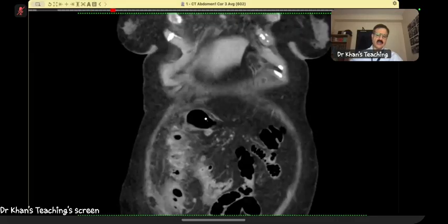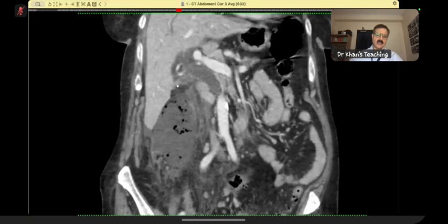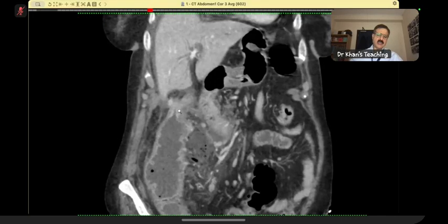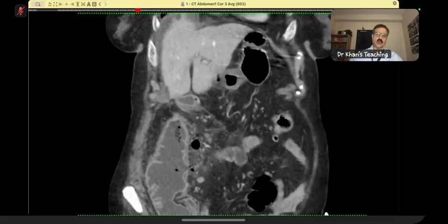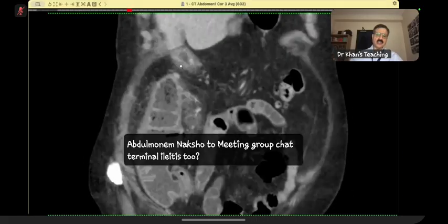So let's see it again. So we are into this. This is the gallbladder, a contracted gallbladder, and here you are. Please remember that whenever there is fistula, the walls will enhance. So here it is communicating with the hepatic flexure or the junction with the ascending colon, and there is a stricture. This stricture is, of course, an inflammatory stricture. Because of that, there is proximal dilatation. So this is the point of transition.